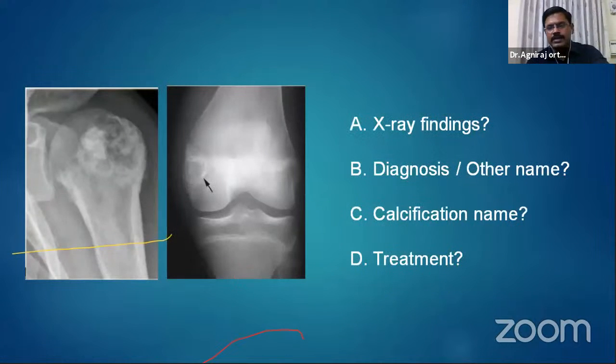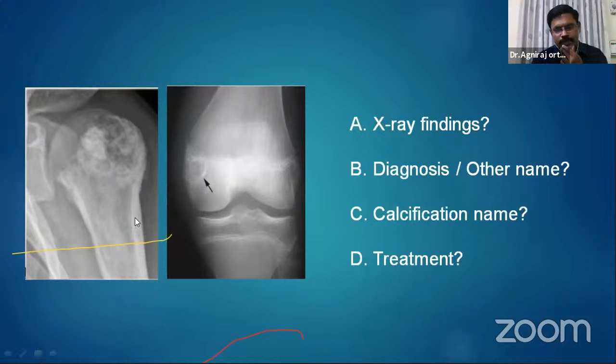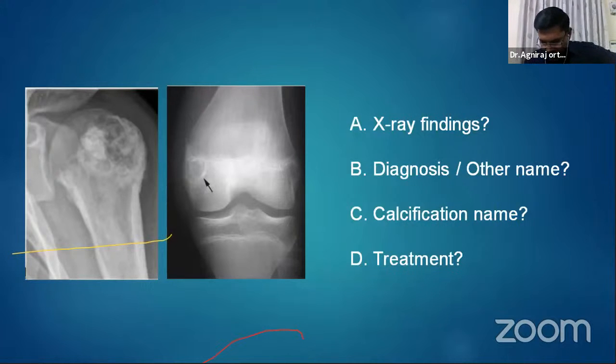Okay. Now we are coming to the last slide, a simple slide. The person left is Suresh Lakshmi. We started with Suresh, we will finish with Suresh, sir. Both are different areas, but the same diagnosis. Okay, Suresh, are you there? Anybody can volunteer and read the X-ray. Last X-ray, we will finish. Uday Kumar, Gautam, Vishal, anybody can answer.